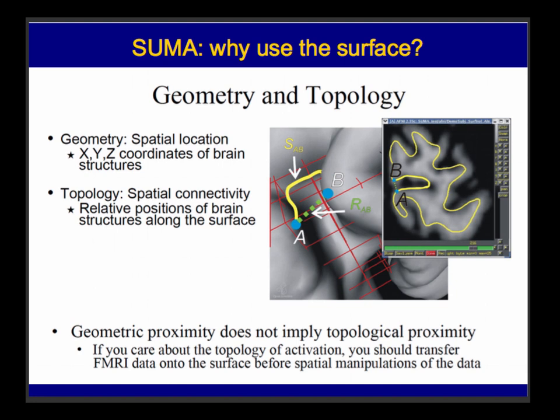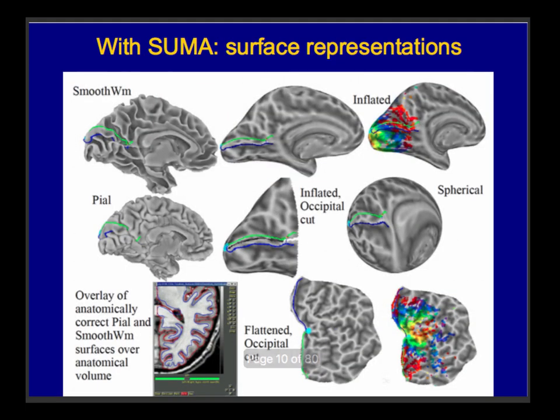And so it's the same idea. If you live in Morocco and you have a friend in Spain, you can wave at them. If you want to go visit them, you have to go all the way around the Mediterranean. So these are the kind of things that we have to be careful of when we're processing. And we can play around with changing geometry, and these are all topologically the same. So going back to here, all the data is still the same. It's not really being changed. It's just like taking this and reinflating, taking a raisin and rehydrating it or something like that.